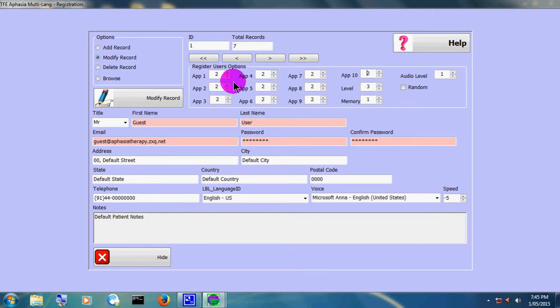Now, the patient may continue with the 10 records that you have set for a certain length of time, say maybe 10 days or a month, depending on the progress, and after which the patient will be working through these records more from memory than from any real working out of the logic. So you would like to change the records or make it a little bit more difficult, in which case you will need to change the setting here and change the records. Okay, having changed this, and one more thing, this is as far as the record sets go.